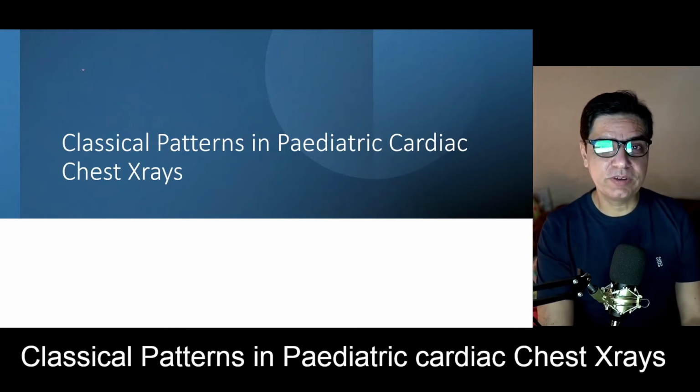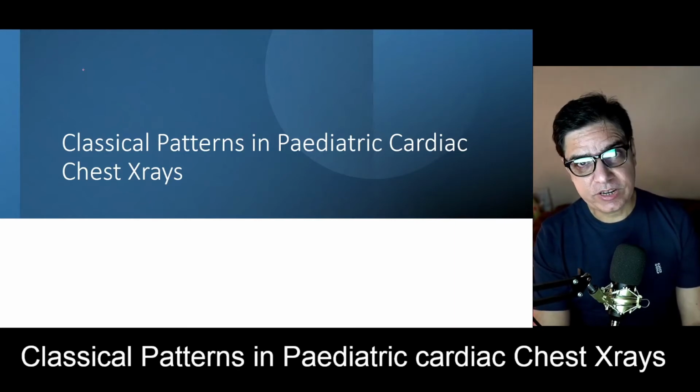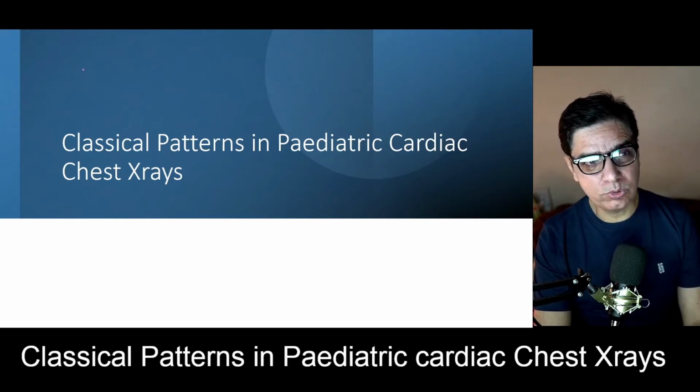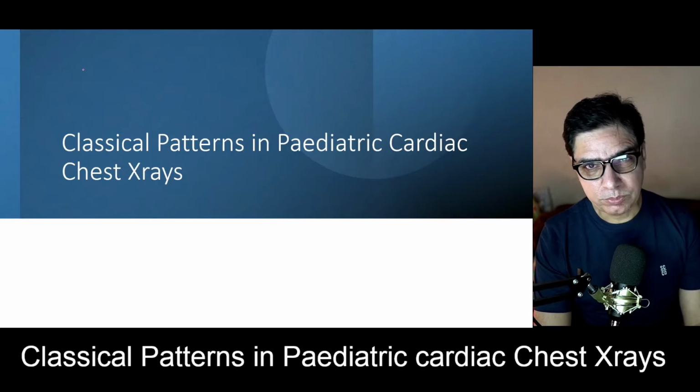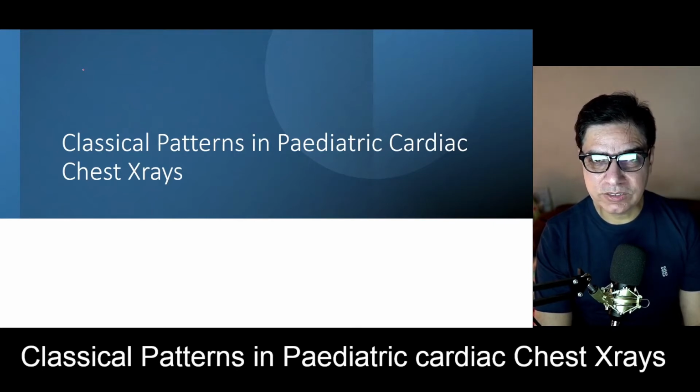We will be talking about X-rays, in particular chest X-rays, and this is not going to be a generic lecture on how to read X-rays. This is about how to read particular signs in pediatric X-rays when kids present with cardiac problems. To put it in simple words, kids who have underlying cardiac problems, especially congenital heart problems, if you are lucky, you might come across these signs when you do chest X-rays for them. So let's get started.